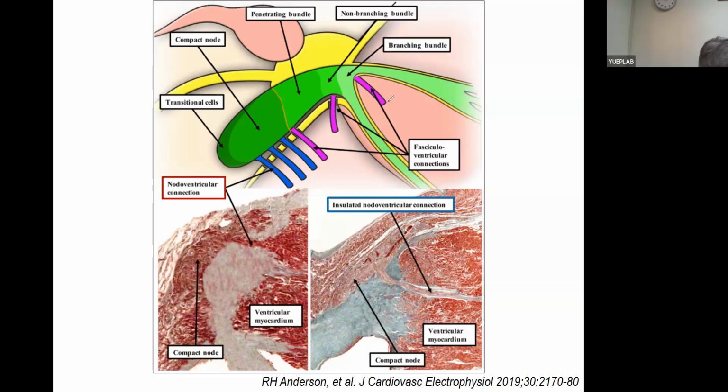And regarding the left-sided nodal-ventricular pathway, he mentioned that if the left side is involved, often they develop functional left bundle branch block. So when you look at a narrow complex tachycardia with the cycle length 40 milliseconds longer, then you know it's the left side. That's a clue. Like Coumel's law, it is valid in the nodal-ventricular pathway as well, even though it is concealed decremental. So think about that as well. That's how we made the diagnosis of our case, and Dr. Scheinman also described it the same way, with just some variation there.